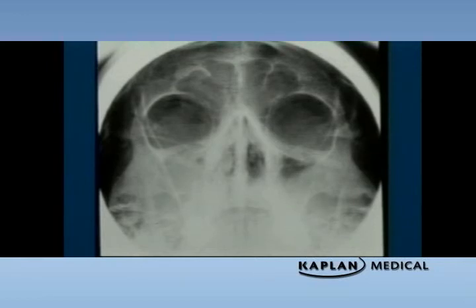This is a facial film looking at the sinuses. This is to show you opacification of the sinuses. Open, air. Here we have opacification of the sinuses. Here we have air, here we have opacification. So this is sinusitis, and this is air in the sinuses. So this is opacification of the normal sinuses. These are the frontal sinuses, open, air-filled.